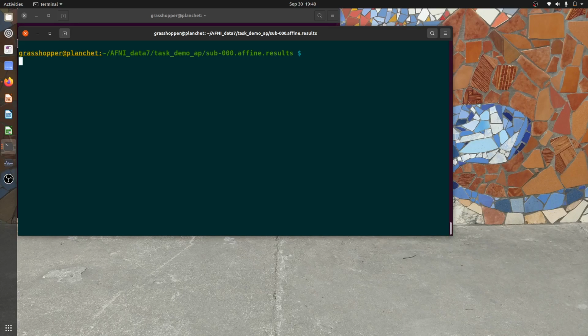All right, now let's start going through some of the actual fMRI data quality using the quality check. So we're going to go through pretty systematically through all the sections of the QC HTML for this bootcamp subject here, the AFNI Data 7, more recent bootcamp subject. And you can follow along with any subject using a modern output here.